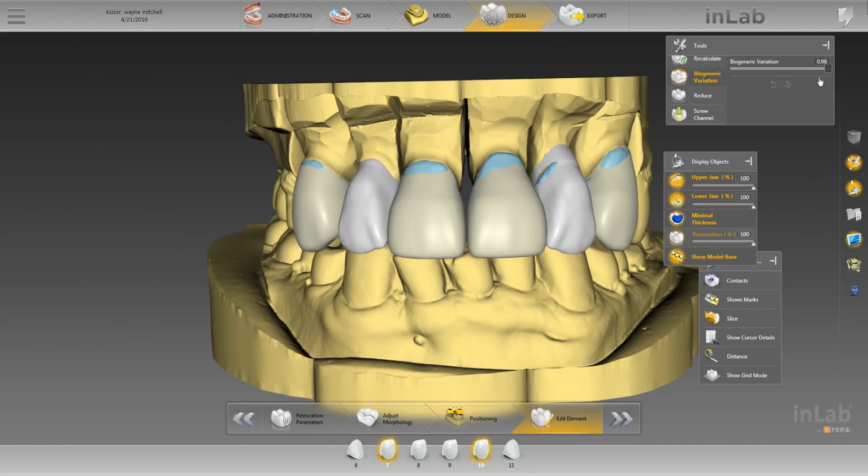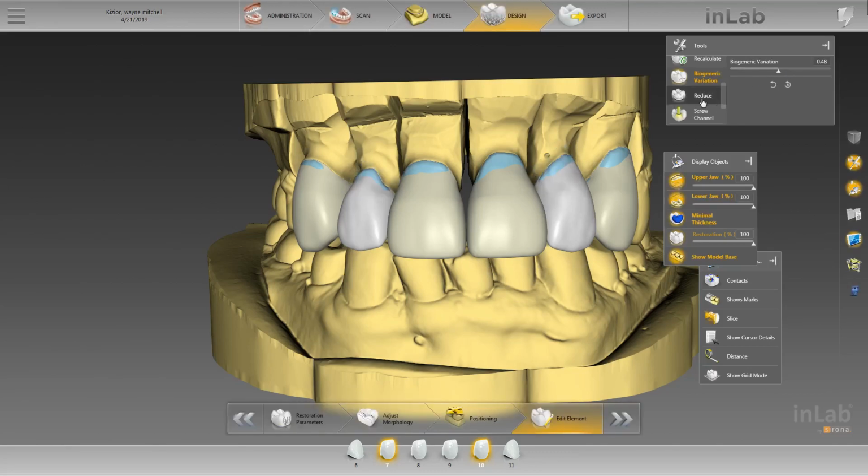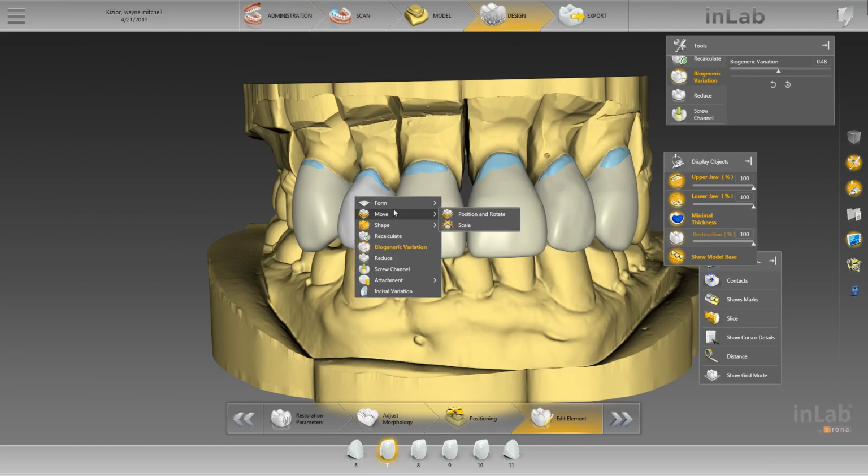So definitely not there. There. Let's stay in this range, and we could flatten things out manually. Turned out great. So we'll then focus on the laterals individually, and then move on to the cuspids and save the centrals for last.